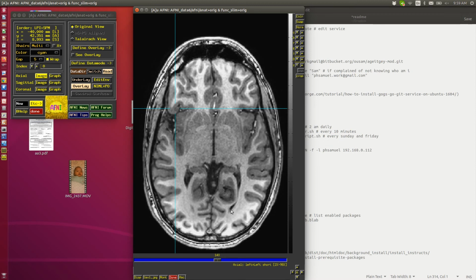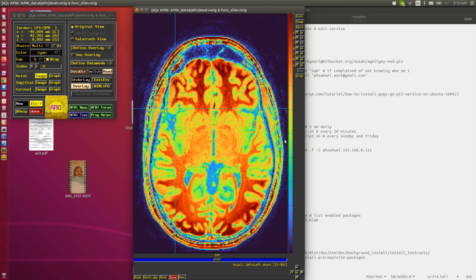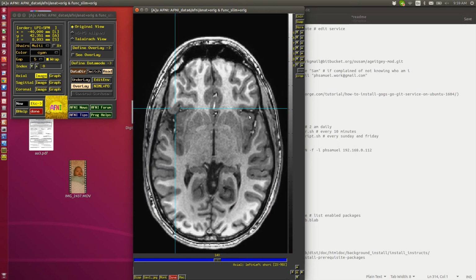And if you want to be really fun, you can change it so instead of being a grayscale bar, it's a color bar, which you have to admit looks nice, right? Is this useful? Seldom. But if you're trying to make artistic stuff, it's kind of fun. But in any case, image viewer. I'm supposed to end in 15 minutes, so let's accelerate this process.